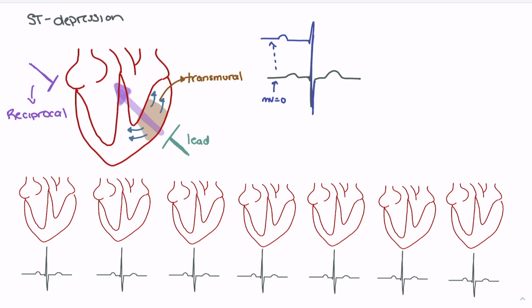Now, what's interesting about this case is, just like we talked about before, when the ventricle depolarizes, that counteracts any injury potential. When the ventricle is in the depolarized state, this opposes the flow of electricity that we see from that injury potential. So that is the only time that this transmurally infarcted heart is going to see a net millivoltage of 0. Again, when we look at the net millivolt here, it is actually 0. That's going to allow us to go back up when we have our T wave. And then when we get back to this resting period, again, the baseline is increased because we can now witness that injury potential again.